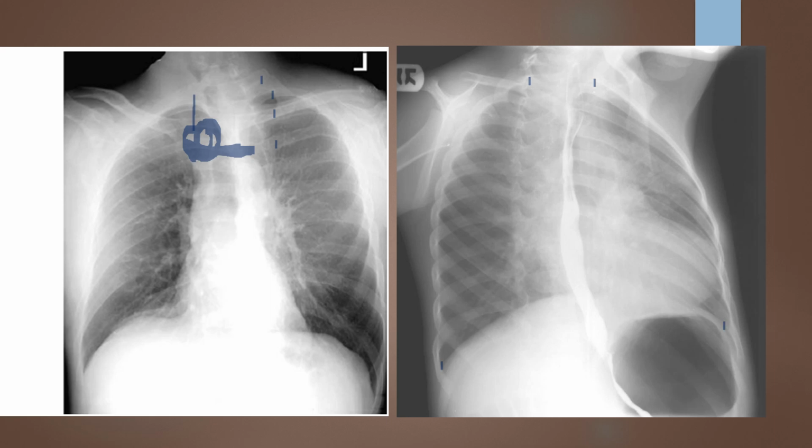So then I would check my patient legalities. They did a great job. They've got a good letter marker on here, thank goodness. I'm going to check my patient name, facility, patient ID number, or date of birth or MR number, exam time and date. If those are all on there, then we're going to proceed.